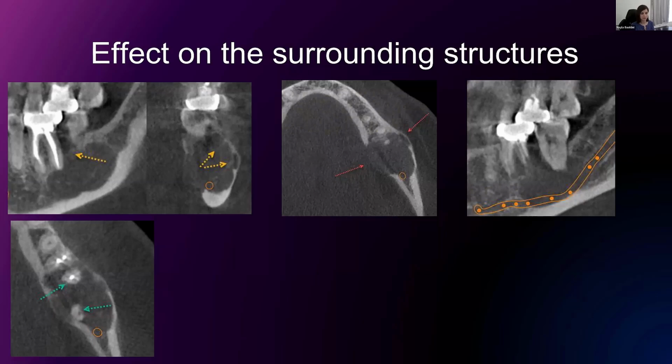Because when it's malignant, it tends to destruct, interrupt, cause root resorption, like a ragged destruction of the borders. And on this axial view, we can also appreciate root resorption on number 18 and 19. So you see how different views gave us different information. Hence the importance of looking at all these different views when analyzing a pathology.